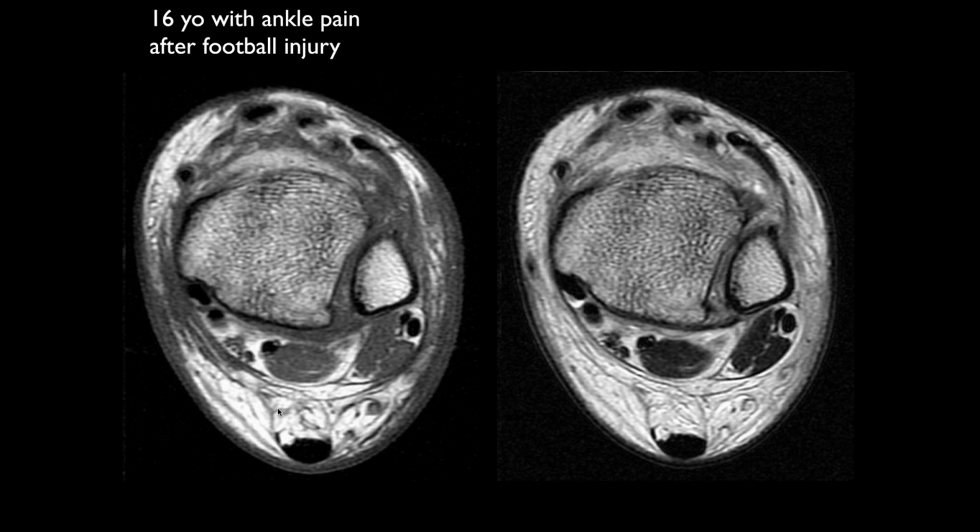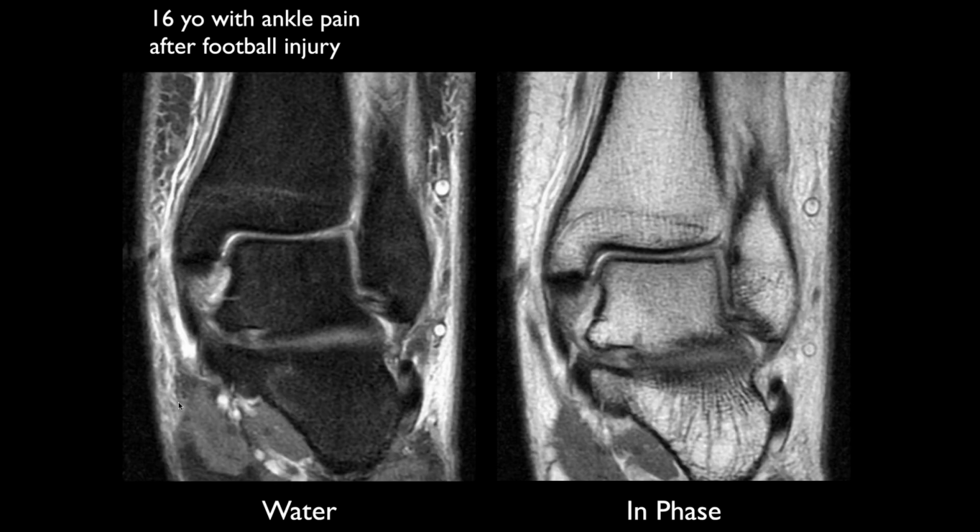Let's go to the axial images now. It looks like this is a little too high, but maybe this is a tear of the ATFL here. No, we're too high for the ATFL.